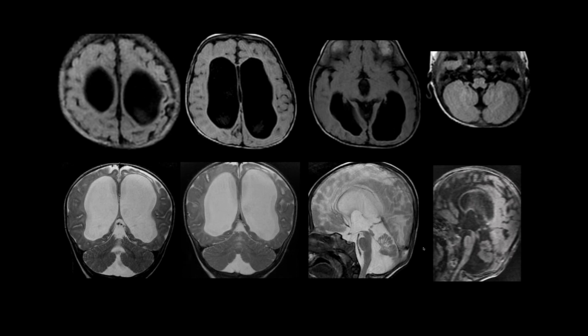At least on the imaging, I wouldn't think it's related to congenital muscular dystrophy because many features are absent. And also the presence of the stenosis, if it's a chronically progressive or an acute hydrocephalus, and the injuries are post sequelae of an acquired injury, especially the left periventricular region. Also, the cerebellum might have been affected. So that is pretty uncertain. Yeah, I would agree.